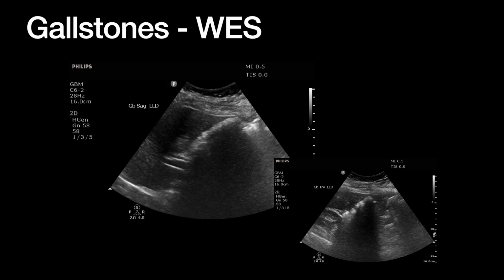Based on the physics principles, what you should see then is essentially the anterior surface of the gallstones, right, in a deep dark shadow. And that's it, right? And this is what we're looking at with the wall echo shadow sign, right? You'll see the wall, the anterior wall. You'll see the echo, right, the gallstone surface or interface, and then the shadow, right? And you won't see anything else.